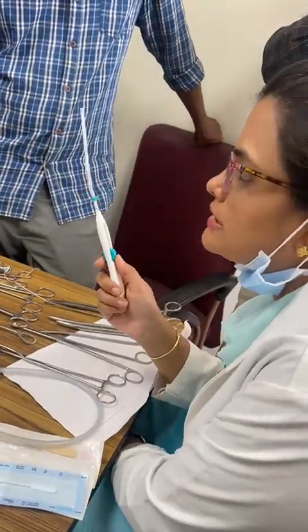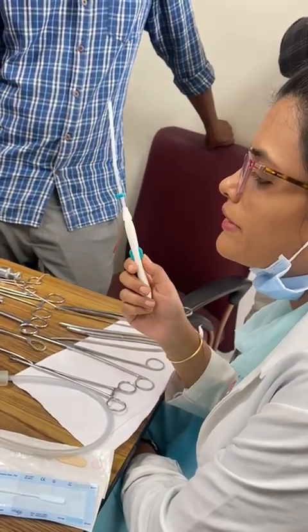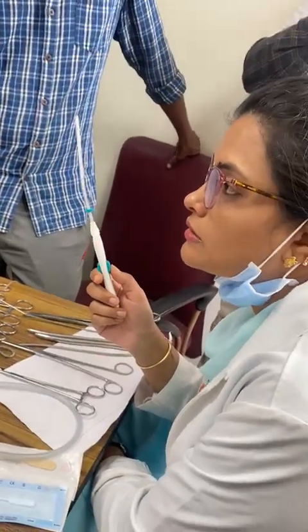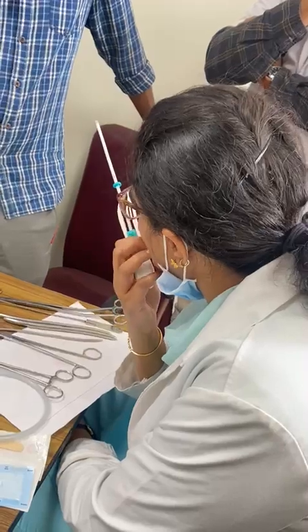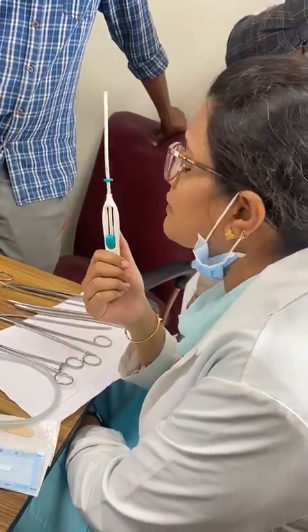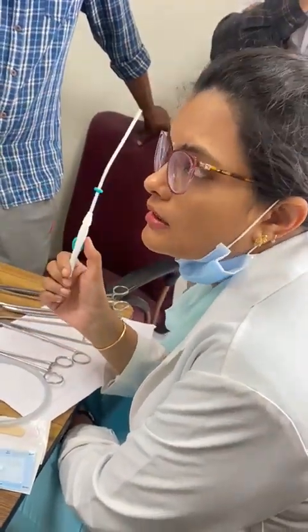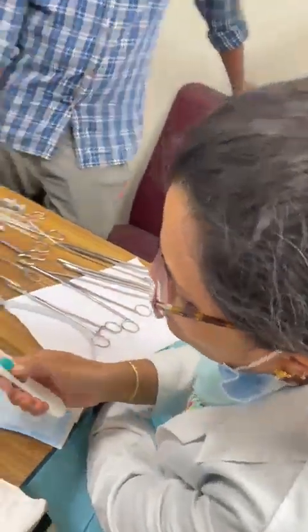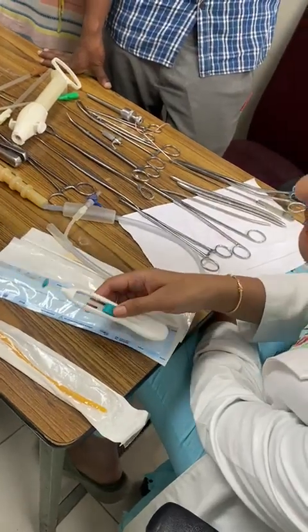Cannula or the LNG-IUS. Again, indications for LNG-IUS you should know: when it is used and what is the amount of drug. What is the amount of drug? 20 micrograms every day. And what is the 50? Those things you should know. Okay, and this is the push and pull technique. That is all they're going to ask you. They're not going to ask you how to demonstrate and all that. Most probably, if you answer everything, maybe they'll go towards that.